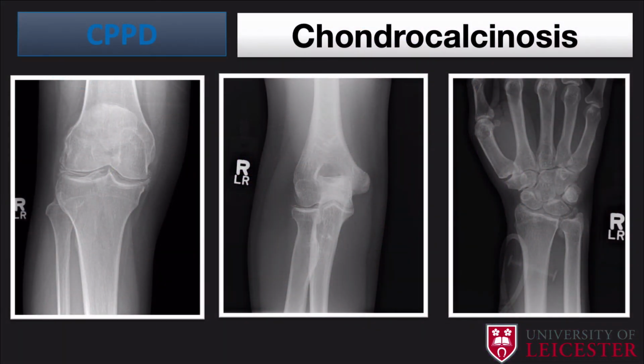As a result of that, from a radiology point of view, you have quite specific hallmarks and radiological manifestations. So here we've got CPPD, and this deposition within the joint is quite classical, something called chondrocalcinosis. So this is cartilage calcification. In the knee joint, it can occur within fibrocartilage, so here within the medial and lateral meniscus of the knee. Here we've got hyaline cartilage, so there's quite a very fine rim of calcification. Sometimes it can be speckled calcification within the cartilage, particularly paralleling the articular surface.